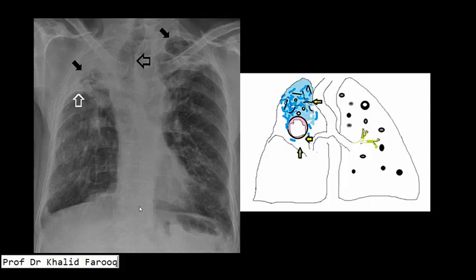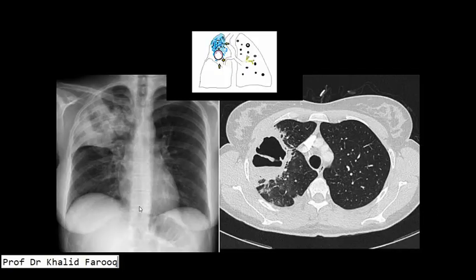volume and mediastinal shift. Here in this slide we have an example of post-primary tuberculosis, where we can see consolidation and irregular thick-walled cavity in it involving the upper lobe. Here we have a few examples of irregular thick-walled cavities representing post-primary tuberculosis.